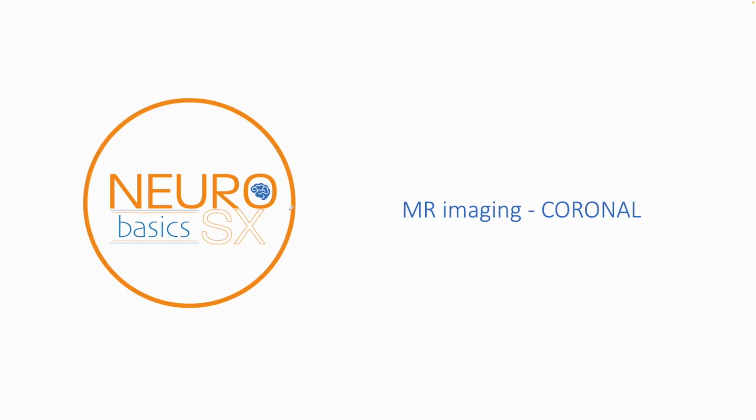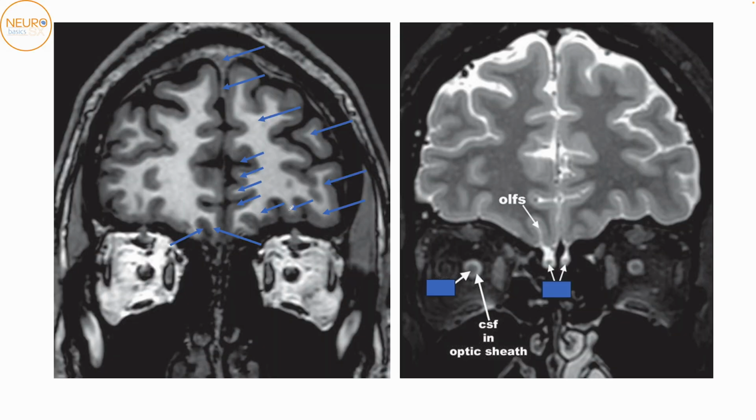The final discussion would be on the coronal sections, and we can use a lot of the anatomy that we've already learned with the axial and the sagittals to really understand what is happening with the coronal imaging. It can get slightly complicated, but if we remember whatever has happened with the prior two sections, we can easily pick up as to what is happening with coronal imaging as well. Right, so this is coronal imaging running from anterior to posteriorly. Again, T1 images on the left side and T2 images on the right side.